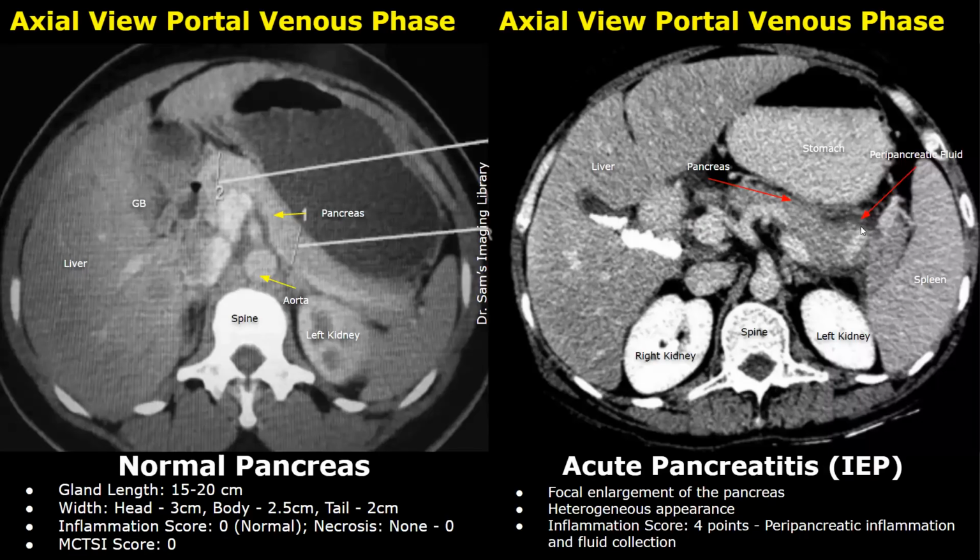Fluid appears hypodense. It appears slightly darker than fat stranding and will usually not have a streaky appearance. However, there can be some overlap between appearance of fluid and fat stranding in a few cases.